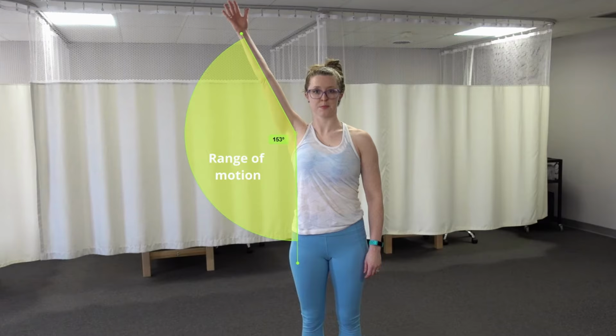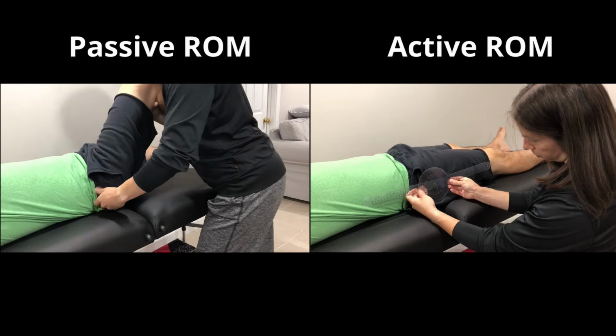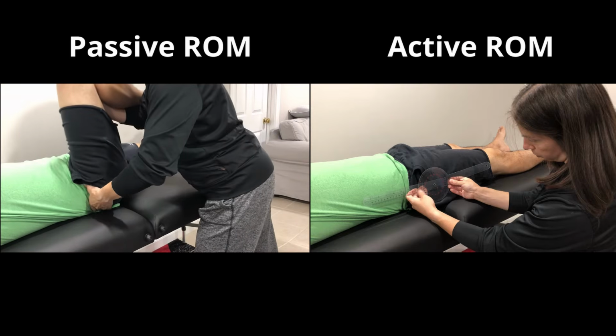Range of motion is a generic number. In order for that number to be significant, we need to understand whether it was achieved actively or passively. So, what's the difference between the two? With passive range of motion, all of the movement occurs as a result of an outside force on the part of the clinician.